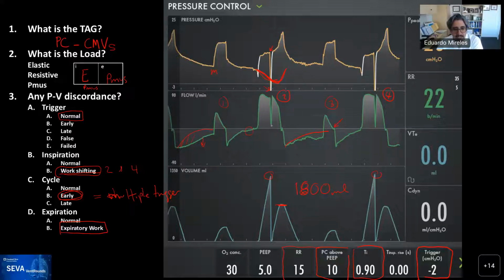So the patient, normally you would expect whenever you cycle, the pressure would drop and there would be flow below this baseline and the patient would be exhaling, but it didn't even happen. The patient is at the maximum of the effort and doesn't release.